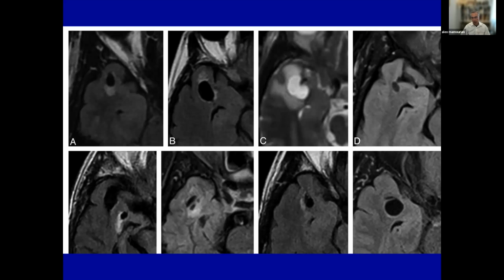Or to put it in another way, how can you be sure that this is not a low-grade neoplasm? And my response would be, okay, it's fine to have some degree of uncertainty, but if you're going to advise the clinicians correctly and help your patients, I think the best thing to do in circumstances like this is to just indicate that this can be a benign phenomenon unrelated to the seizures. And I would say the best thing to do in cases like this is to just follow them. You want to pick a follow-up in 6 months, because if you're thinking it's a low tumor, it's going to be low grade.